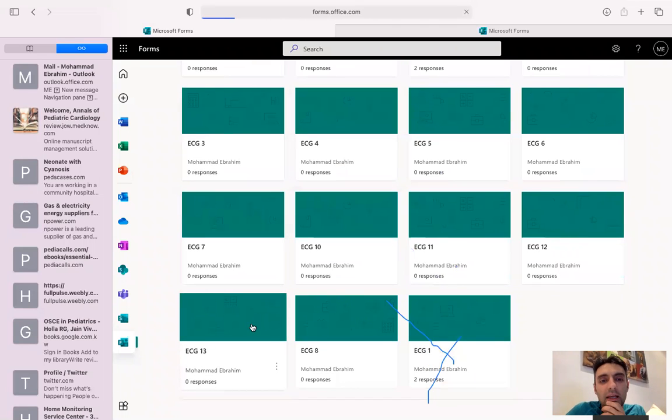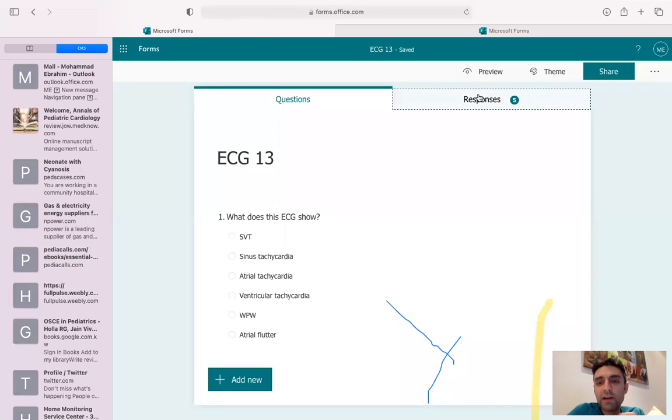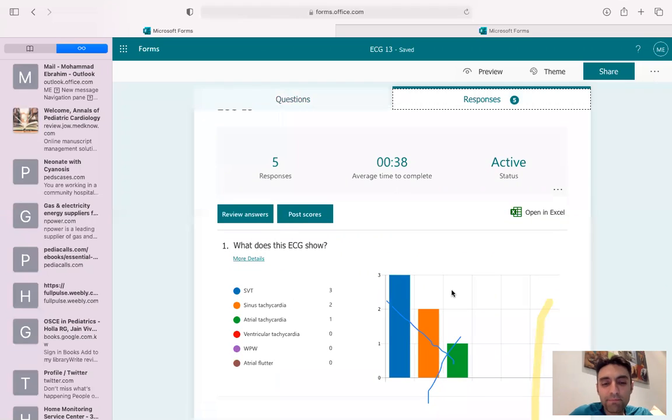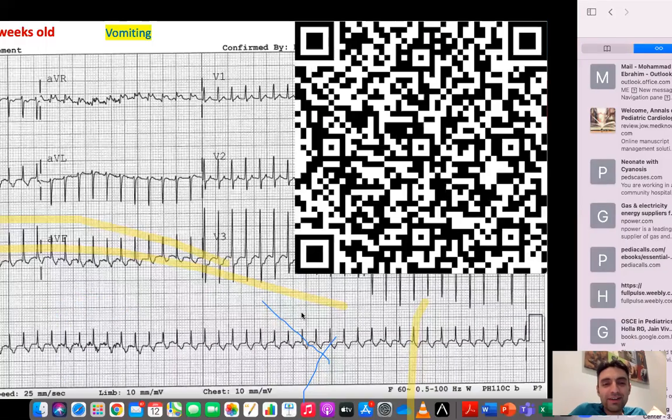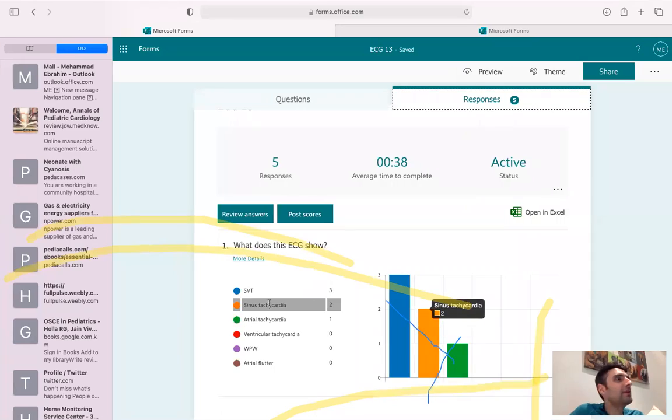Look now, 0 responses. So you guys submitted something, right? Oh, there are 5 responses, sorry. Okay, so interesting. 3 people said SVT, 2 people said sinus tachycardia, 1 atrial tachycardia. Okay, good. So we have a mixture of answers. Okay, who said sinus tachycardia? Can you say why?